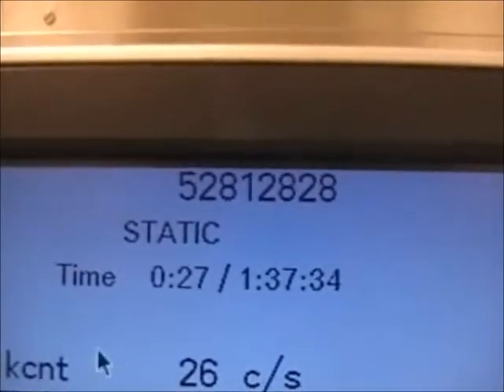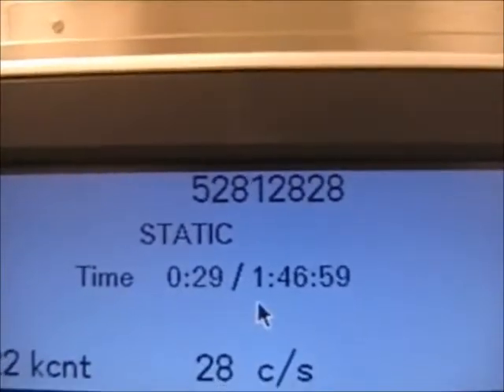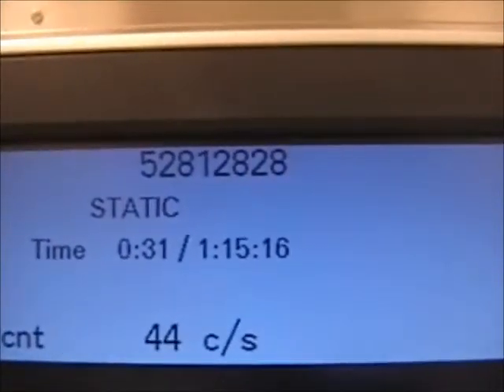What else did I say? It shows the time. It shows the time of the image, where your camera heads are positioned for that image.